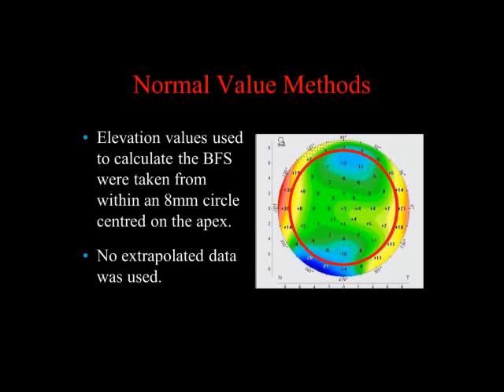We, again, for the reasons described before, use an 8mm best fit sphere, computed from the central 8 millimeters, because that allows the quickest visual inspection. And all our normal values are based on a best fit sphere centered on the central 8 millimeters of the cornea. We did that for two reasons. I said earlier two, but I only gave you one. The first one I gave you is because it tends to normalize the normal asphericity.